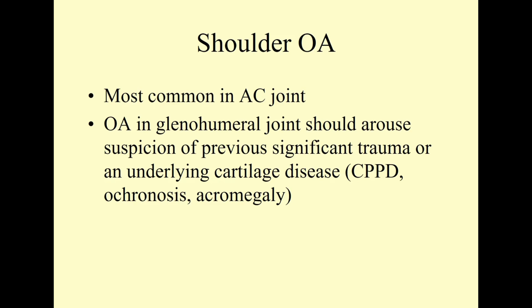It really is the only joint space I really remember that can present with subchondral sclerosis, marginal osteophytes, but a widened joint space. These are almost always post-traumatic examples. Patients landed on their shoulder, had a distractive injury to the AC joint, changed joint integrity, and otherwise created conditions for a DJD of the AC joint.